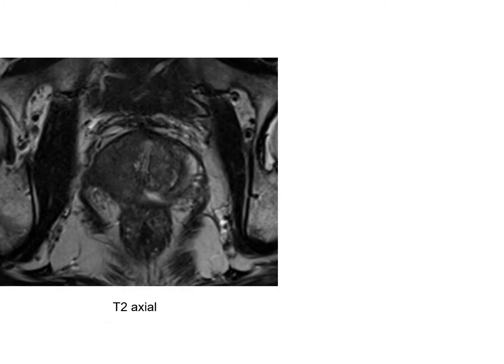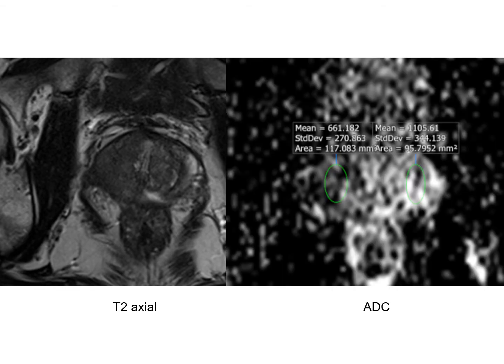And I think this is another example. So here you can see that there's a tumor probably in the right gland, which is showing low signal on T2. And you can actually put an ROI on the ADC map, and that gives you a quantitative measure, which may be useful. So here we would say it's 0.6 in the involved side, and it's 1.1 in the uninvolved side. You divide by 1,000. So that may help to quantify things if you need that.